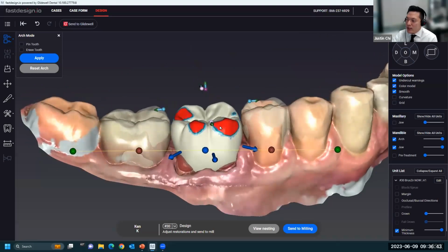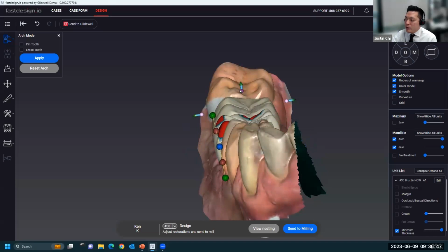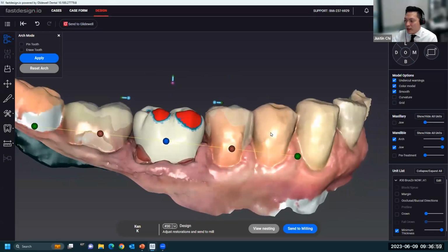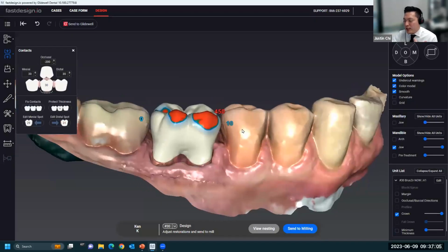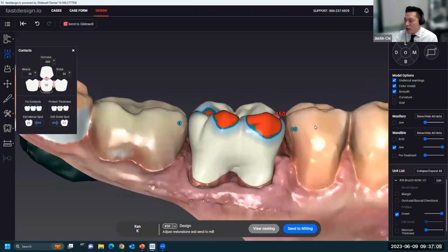So let me just quickly get this library tooth back into position. Remember, we lowered the lingual down a little bit. The reason why the buccal might be lower is perhaps due to the original occlusal position that I had set on the previous page. Maybe it was just angled slightly to the buccal. All right, so let's go and reapply. So again, getting the size, position, and angulation. And notice how now that ghosted tooth came back over 29, we have a number over the mesial.